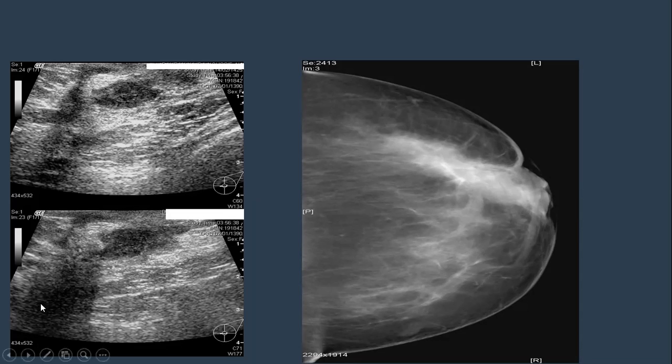Not one. This is one. This is one. Okay, multiple. Yes, multiple interconnecting intraductal masses or ductal masses. Why did you say intraductal masses? Because they are distributed. This is one, this is one, and the direction of this is different. Not all are directed toward the nipple. Overlapped. Interconnecting. Yes.